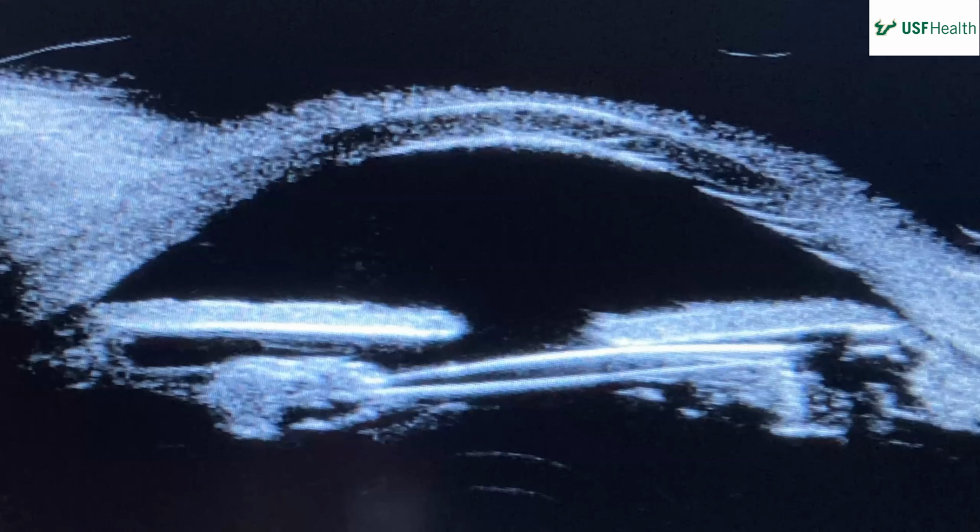Okay, so here is a UBM photo. It does look like behind, or posterior to, the iris there is a hyperreflective material. Good. I guess you're a first year. What do you think that might be behind the iris? So I would imagine the ciliary body and then the trabecular meshwork holding the capsule and the IOL.